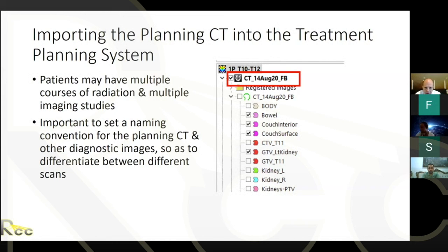The only trick there is with image guidance, how to best set up the patient, not very easily for your cone beam at the machine, or however you're doing your image guidance. So in that case, you have to think about that. Usually you set up to free breathing or something like that, and then treat and gate it. But there are a lot of details there that probably go a little bit beyond the scope of the basic import for moving from 2D to 3D.